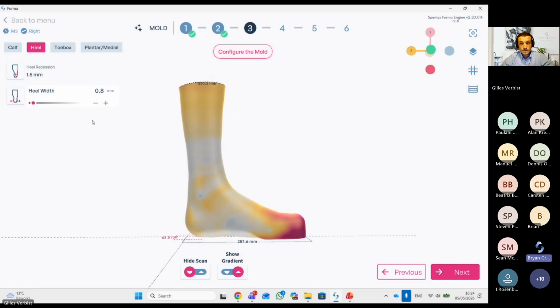So Gilles, you actually bring up a really good point there. Sorry to interrupt you, but no problem. Measurements historically in other non-O&P software, the ability to capture measurements is kind of hard. You have to really know what you're doing. But we thought about that. We heard your feedback. And now when you're making changes to the patient's mold, you could see those measurements adjust in real time. So on these next few steps that you're watching Gilles explain, we'll watch how those measurements are changing. And I apologize again for interrupting, Gilles, but it's a really good call out. No problem. Thank you, Brian.